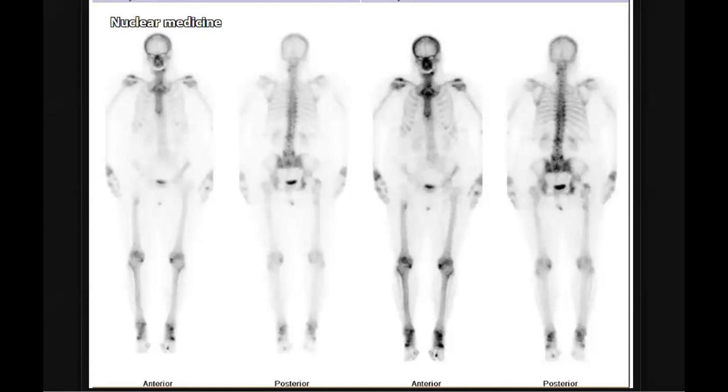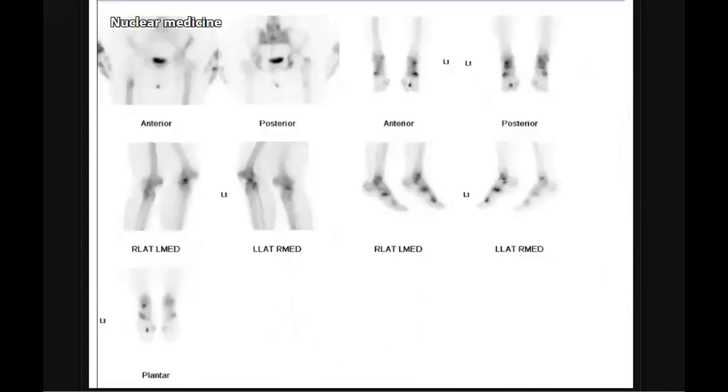Yes, this patient has degenerative changes in the knee. Exactly, yes, some degenerative changes in the ankle. That's good. And some spinal changes again. This patient needs to repeat some views, okay? So we'll have to take some special views in these areas. Let's take these views and try to find the abnormality.